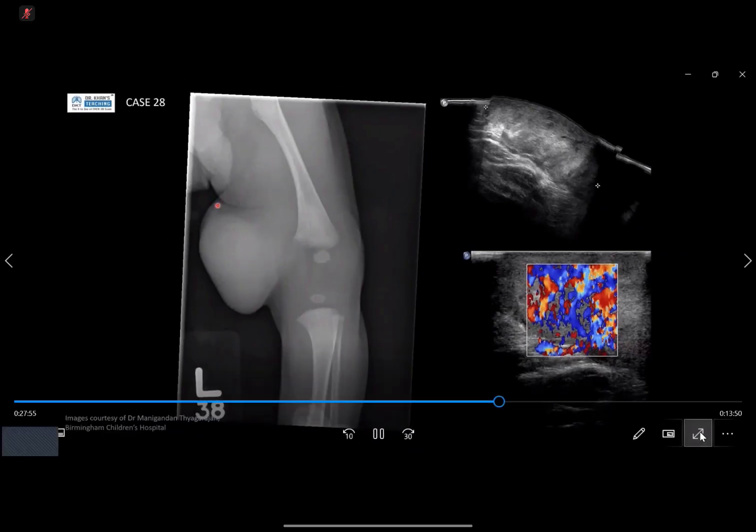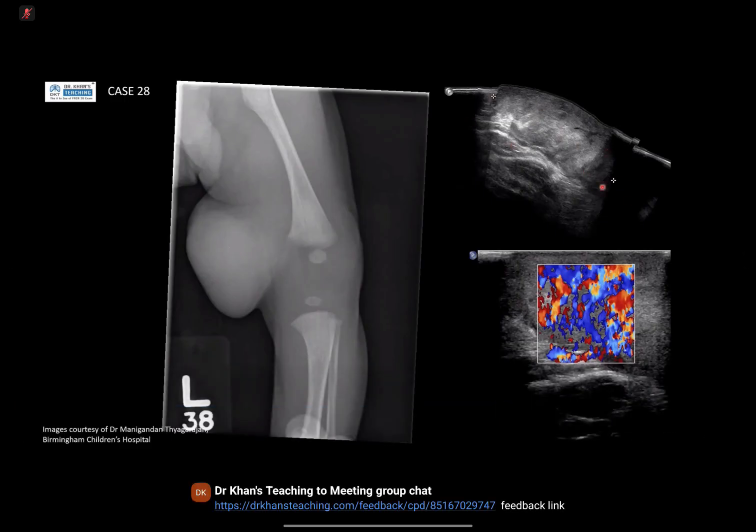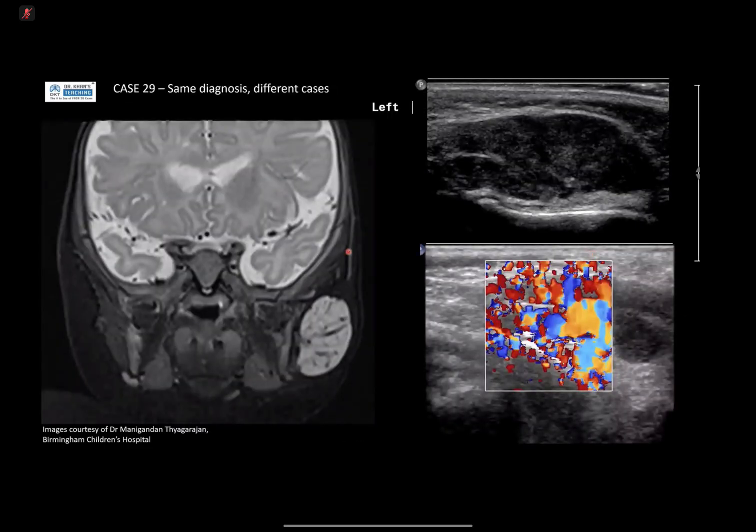So this is purely soft tissue, like what candidate 4 mentioned, no bony involvement, and on ultrasound it can be quite a heterogeneous lesion, quite well circumscribed because hemangiomas are vascular tumors. Okay, they can be compressible, so sometimes they're not so compressible. The more compressible one tends to be vascular malformations, like veno-lymphatic malformations, where they've got more cystic spaces. And the key thing is that with hemangiomas, they're often very richly vascular. They can happen in the limbs, they can also happen in faces.